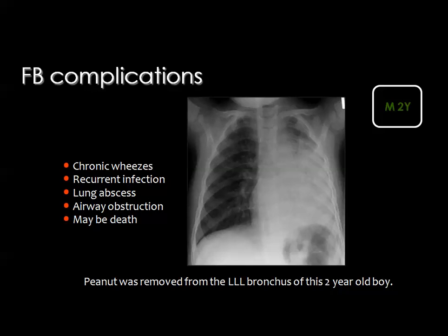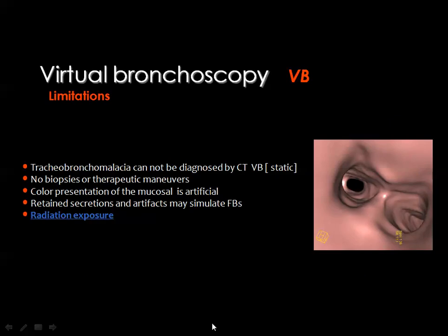Then the complications of foreign bodies will include chronic wheezes, recurrent chest infection, the development of lung abscess, airway obstruction, and maybe may result in death. And virtual endoscope has many limitations. As I have mentioned, the tracheobronchomalacia cannot be diagnosed by virtual endoscope because this is static imaging.